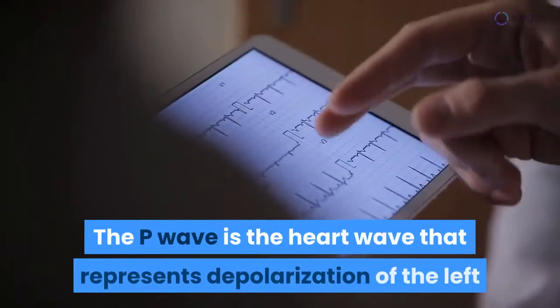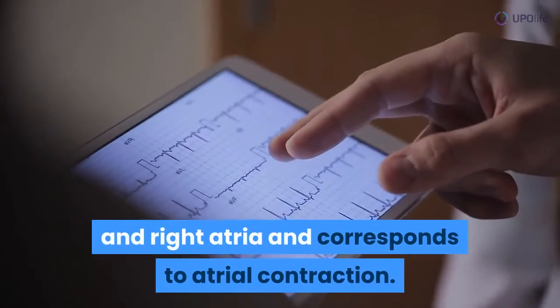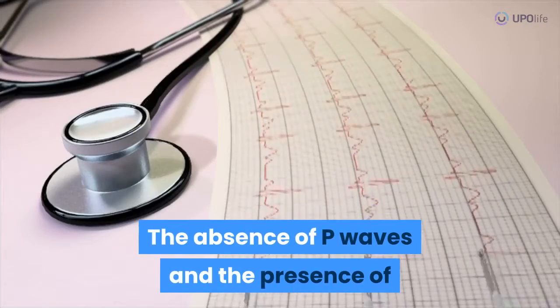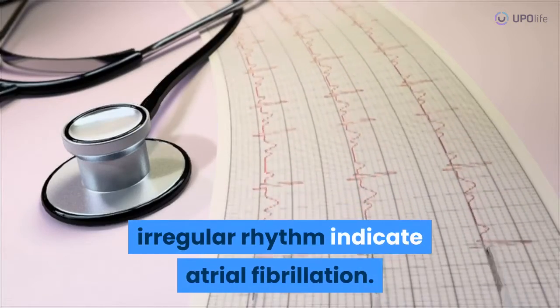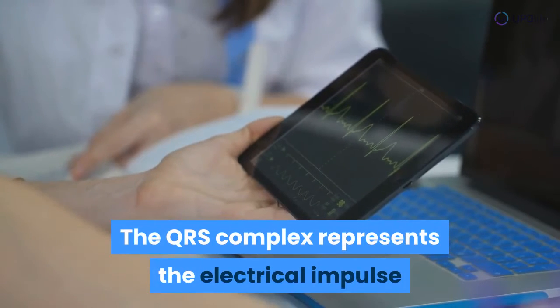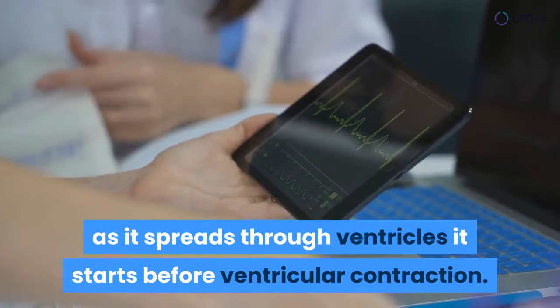The P wave is the heart wave that represents depolarization of the left and right atria and corresponds to atrial contraction. The absence of P waves and the presence of irregular rhythm indicate atrial fibrillation. The QRS complex represents the electrical impulse as it spreads through the ventricles. It starts before ventricular contraction.